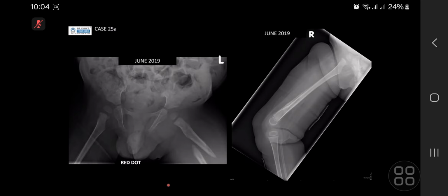Sorry, candidate 4. Are you looking at the left or the right? The right. The right hip. Are you looking at the right hip? Yes. Okay, and are you talking about some abnormalities in this region here? A little caudal to that, a little lower. Lower, here. Above, I think the subtrochanteric region, yes. Okay, so you think there's a malignant process going on here.